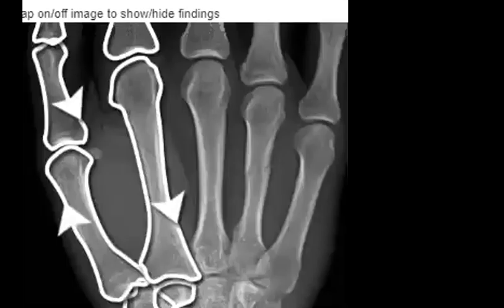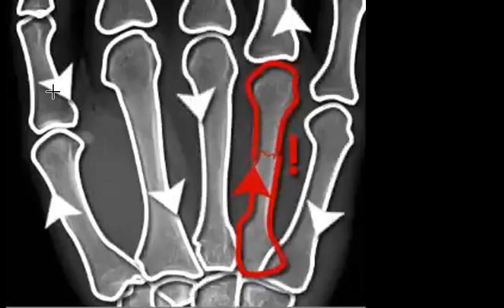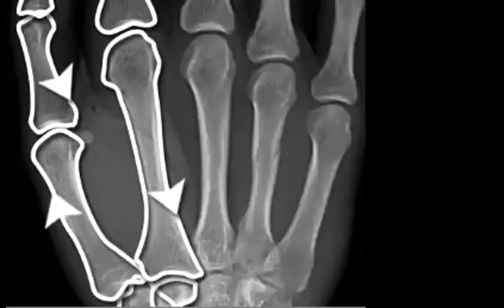And when you check the fractures, as we saw in the rapid reporting, you should go through the cortex to check if there is any fracture line. So here, when you reach this bone, you will find that there is lucency in this area interrupting the cortex.